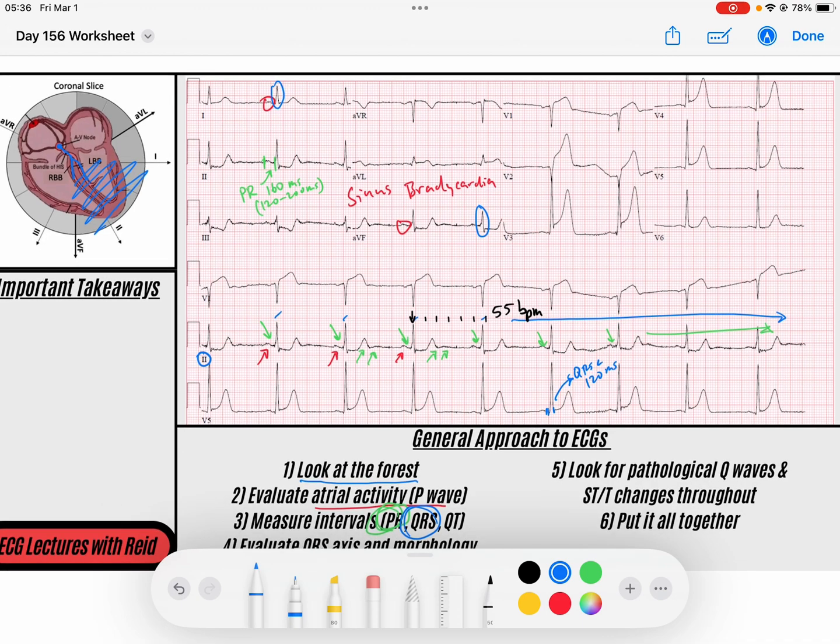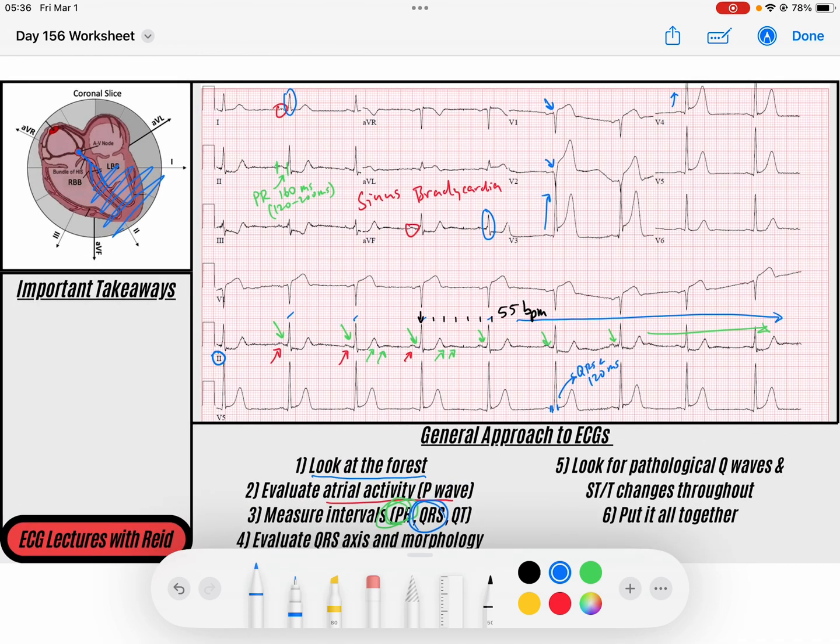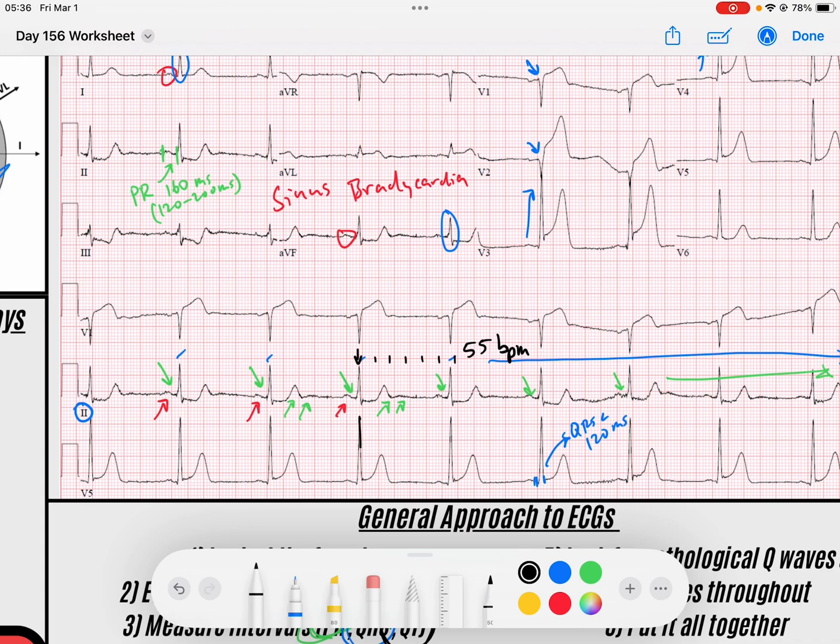And you can see our R wave progression. We've got a slow start, but V3 seems to be nice and upright, and so does V4. So some funky R wave progression; we'll look at that later. When I evaluate my QT interval, I like to make sure that if I look in between two QRS complexes, by the midpoint the T wave has terminated.